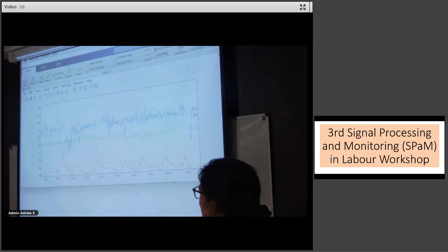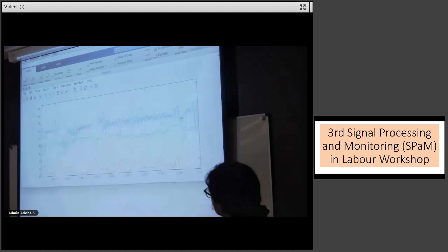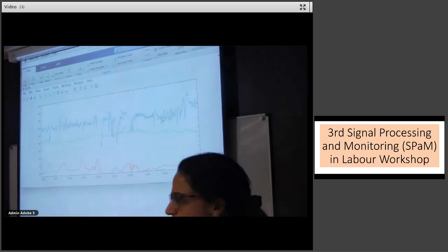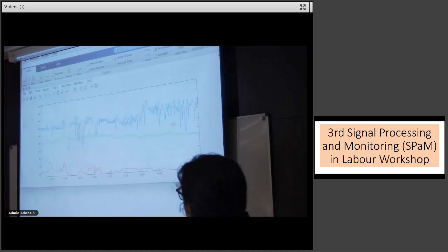Particularly because there's such normal variability in between the decelerations, and because you have acceleration. If you take out the decelerations, it looks like a normal tracing. They're very short decelerations, so I think we just carry on. It's up to the stage of the delivery. At 3 centimeters, 2 centimeters, amnio infusion could be used to get rid of the deceleration. But at 6 centimeters, 8 centimeters, it's also okay, and wouldn't make a difference. Exactly. All right, let's move on.